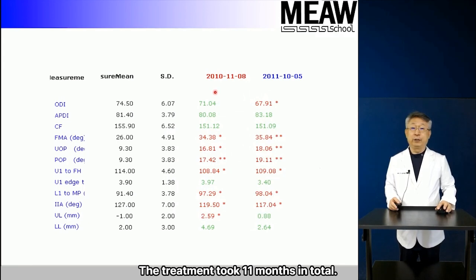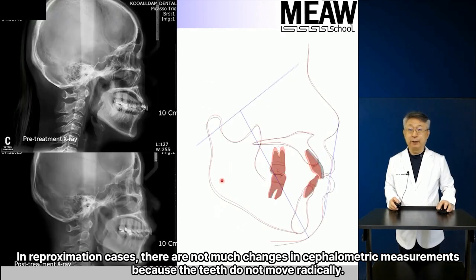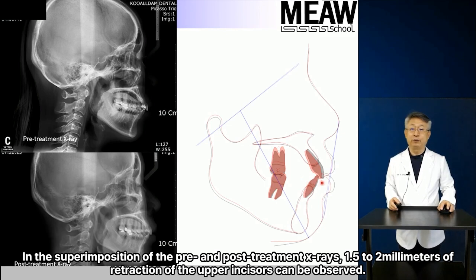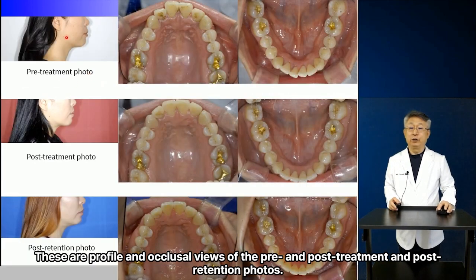The treatment took 11 months in total. In reproximation cases, there are not much changes in cephalometric measurements because the teeth do not move radically. In the superimposition of the pre- and post-treatment X-rays, 1.5 to 2 millimeters of retraction of the upper incisors can be observed. In post-retention photos after 44 months, the occlusion is stable and periodontal health is maintained. These are profile and occlusal views of the pre- and post-treatment and post-retention photos.